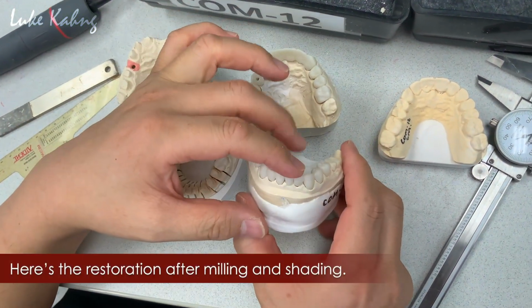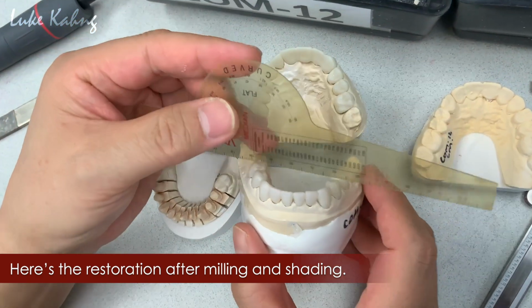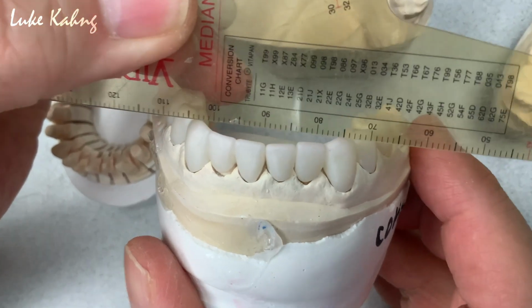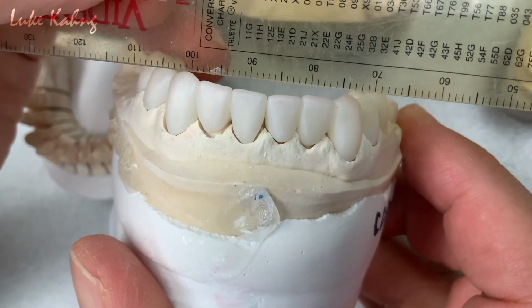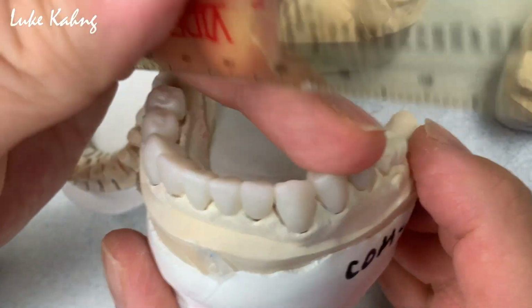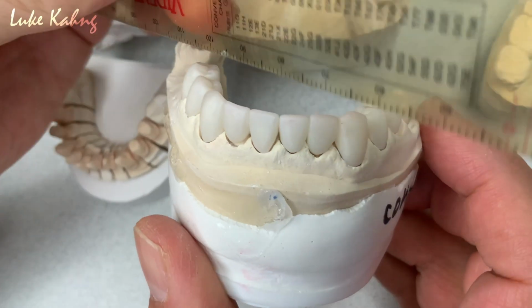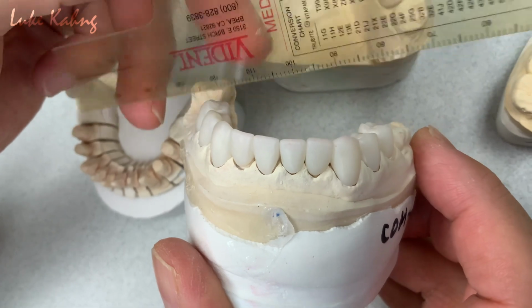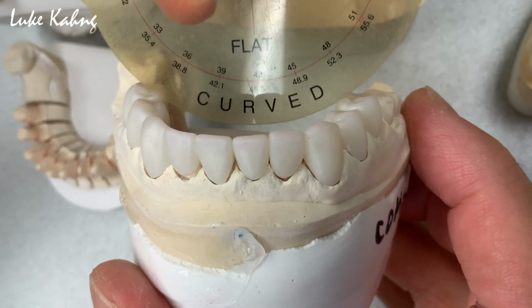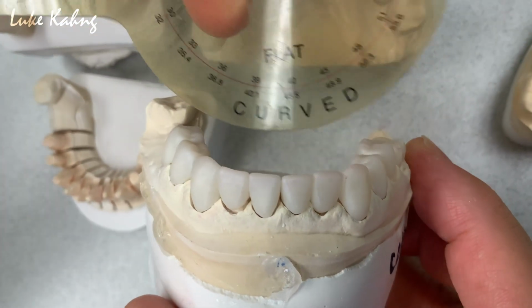Alright, so after we designed it, and like I discussed with my people, I want to get the canine higher, which is canine rise, than the others. Alright, and then step down to the premolar. This is right now a little bit high, so we're going to trim it a little, and this is a little bit high, we're going to trim it. And not only this, we also see the curve of Spee here and the curve of Wilson.